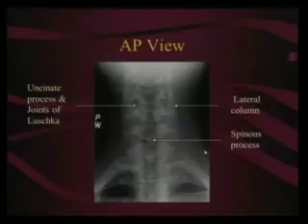Now, some of the books that you might read are going to talk about the spinous processes, and they're going to say if the patient's head is in a normal lordotic pattern, those spinous processes in the center should be closer together, which is kind of intuitive. Unfortunately, a lot of these patients don't have a nice normal lordotic curvature of their cervical spine for numerous reasons that we mentioned earlier. So I don't put a lot of weight in that. I don't spend a lot of time measuring distances between spinous processes on an AP view. The lateral masses, though, are key.